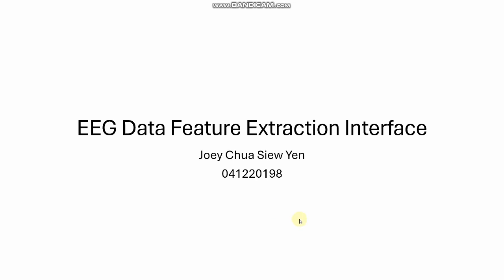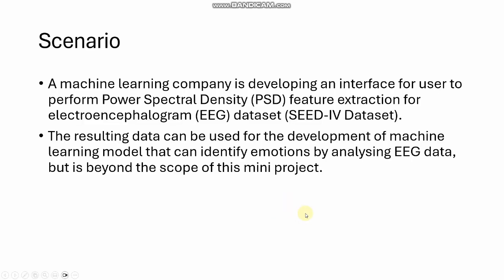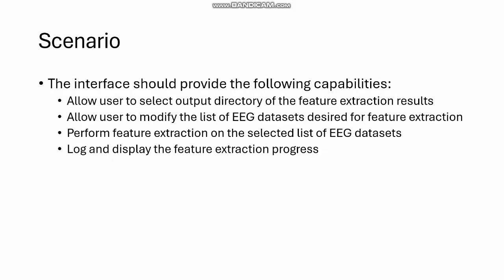The title of my mini project is EEG Data Feature Extraction Interface. The scenario of this mini project is that a machine learning company is developing an interface for users to perform power spectral density feature extraction for an EEG dataset, in particular the SEED-IV dataset. This mini project will be focusing on the interface itself and the feature extraction capability.